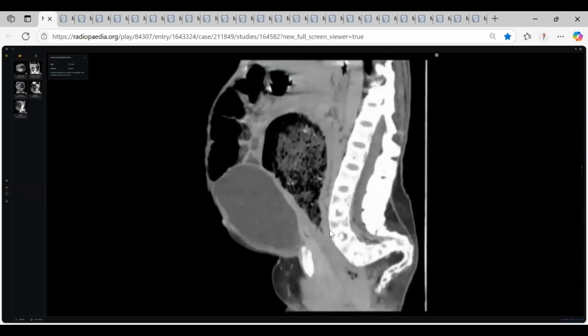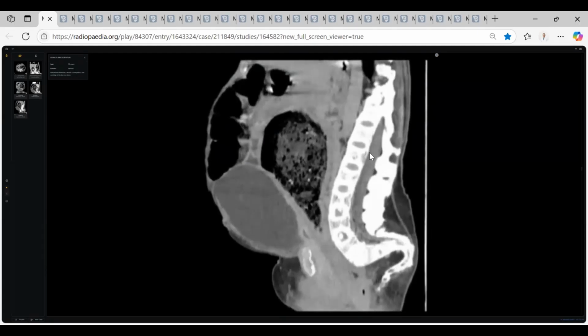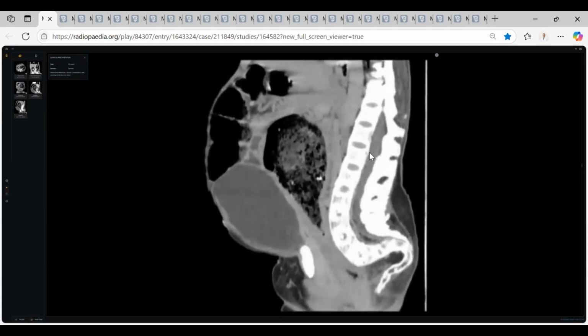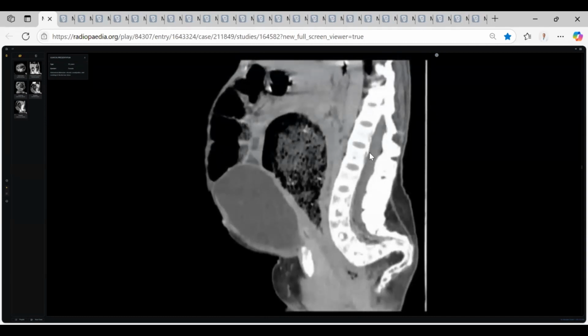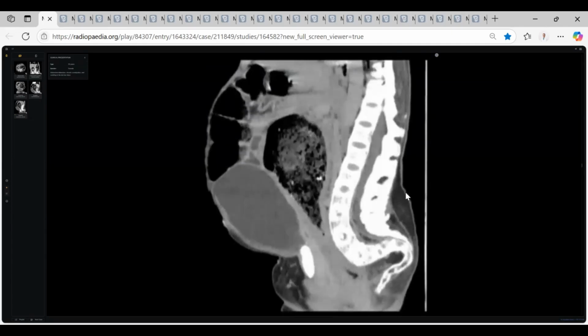Then I ask you what happened here. There is a very obvious pathology. Why didn't we look at the bone? It is a very classic bamboo shape. Correct? Very classic bamboo shape. Okay, my colleagues, this case is a very typical long case scenario. Especially, he will bring you something like this. For differential diagnosis, take care of the site findings, it's very important. One, this is bamboo shape, AS.